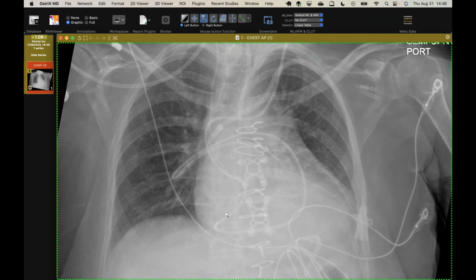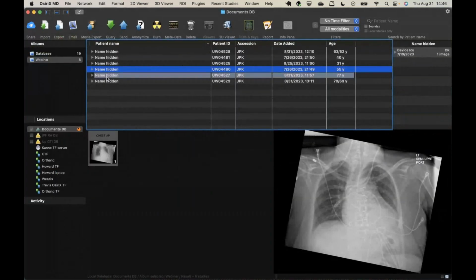So that makes a lot more sense. It's funny, this is the same thing as with the enteric tubes that go down the esophagus, turn around, and head back up to the neck. They snagged on the way down, and then as they push, they just push the loop out ahead. Good thought. Cool. I like that. It makes much more sense now to me. Good. All right.